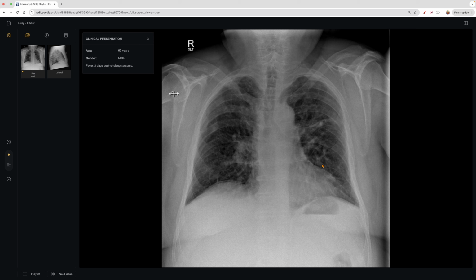So, okay, it's an appropriate inspiratory volume. Fair. Looks a little crowded, but otherwise doesn't look like there's any consolidation. Gastric bubble, sure. Coming across here, costophrenic angle is appropriate. Coming up, coming down. Yeah, okay. See this. Okay. Is that something? I don't know. We can come back up, come down, trachea, and then the bronchi.